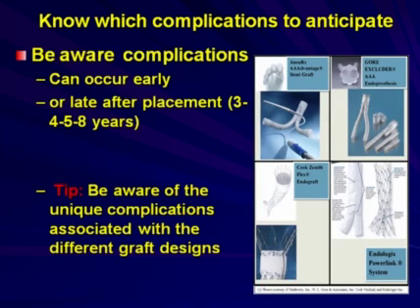In the United States, there are only 4 currently FDA approved for use. That's the Aneurx device, the Gore device, the Cook Zenith device, and the Endologix device. All of these have different configurations and image quite differently. Some of them are modular and some of them are not, so you really need to know what you're looking at and follow those appropriately. The graft design is really important.